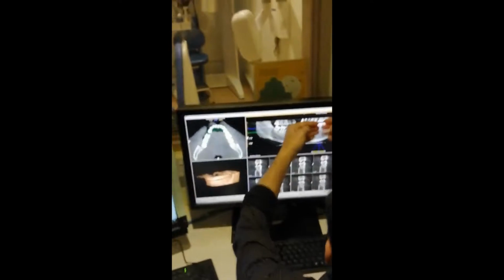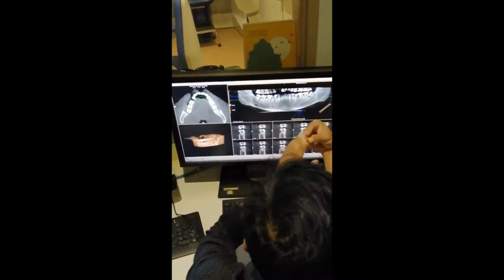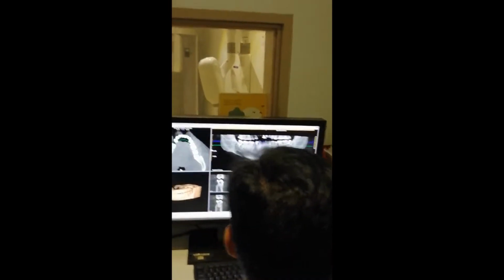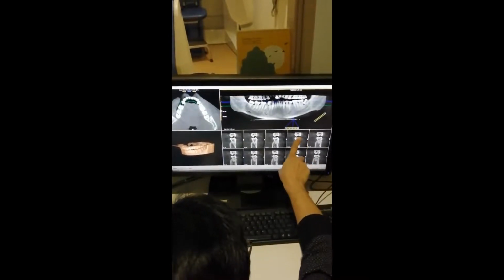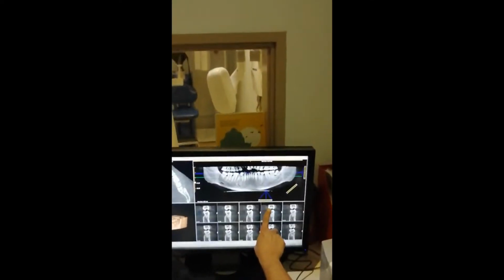All the sections. See, this is a mandible, right? I just take a knife and cut it, and then I open it like this. So this opening, what we see is here. You understood that? That is why it is giving this. When I open, we should know which is buccal and lingual. This side is a buccal cusp, and the other side will be the lingual cusp. What we see here is the tongue space, and this is with the cheek. Got it? All of you? Okay.